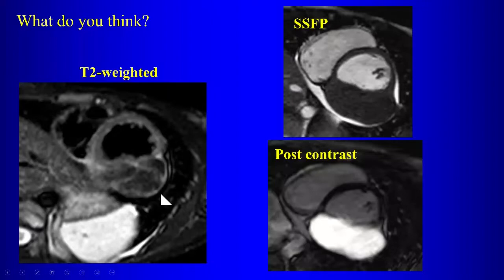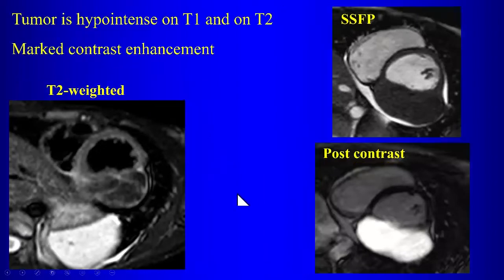So what is this tumor? Fibroma, right. So dark on T2 is a characteristic of lesions that have a high fibrous content. So you'll see this, when you're doing pelvic MRI, looking at leiomyomas in the uterus, they will also be dark on T2 weighted imaging. So tumors with a high fibrous content are dark on T2. This is a fibroma within the heart, and you can guess that based on the imaging characteristics.